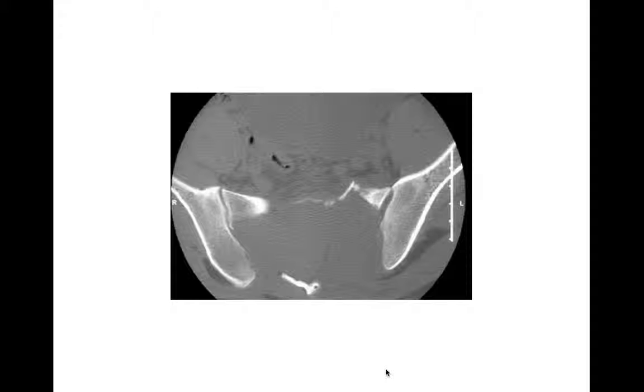Chordomas are lesions which occur along the midline from the clivus all the way down the spine to the sacrum. And so a frequent favorite location of a chordoma is in the sacrum. You can also get giant cell tumors in the sacrum as well. And chondrosarcomas can arise in the sacrum. This doesn't have any chondroid matrix. This one turned out to be a giant cell tumor, but you're probably stuck with a differential in this case based on this one image.